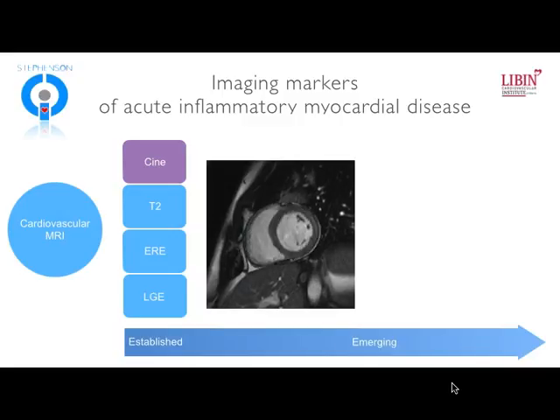And so in this patient here, they were not identified to have any abnormalities by echocardiography, however, had a positive troponin and a normal cath. And so the patient came to CMR where, at least visually and objectively by LV volumes and stroke volume, the cine suggested there was normal LV function.